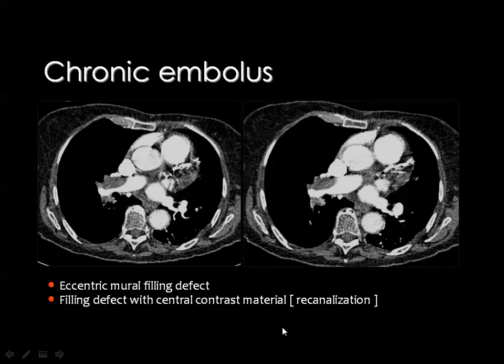Then if the embolus is chronic, it will have an eccentric position within the vessel, and you got some patency of the vessel compared, and the embolus is eccentric.